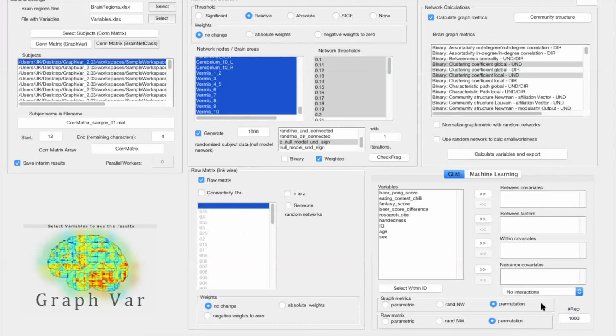So for example, if you have two groups, and you want to make a comparison between patients and controls, then this means that the labels are swapped across groups in a random way 1,000 times, and then the same test, for example, a two-sample t-test, is computed for each of those 1,000 random groups. Then those test statistics from the random groups are captured, each until 1,000, and from those, the null model distribution is built.